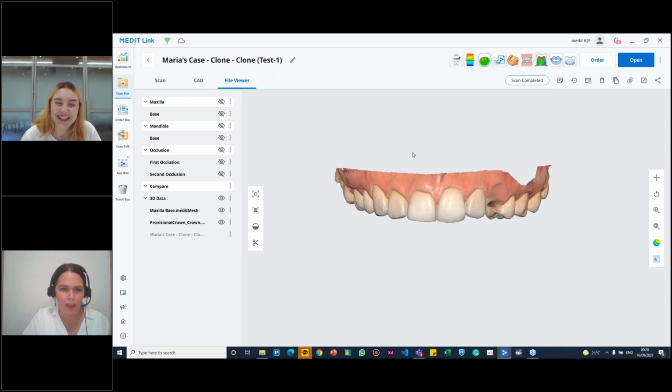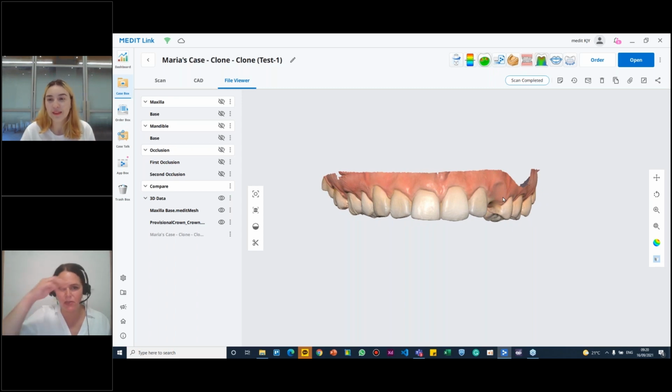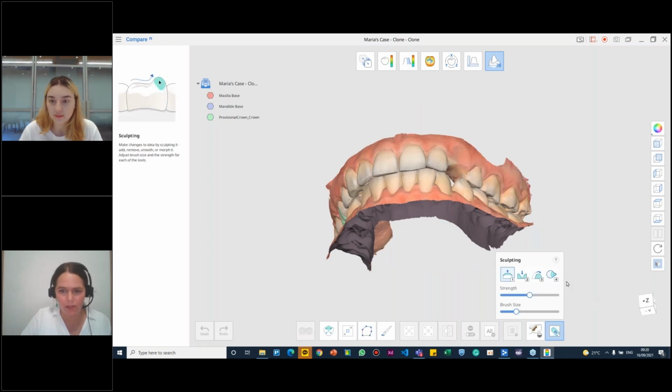Awesome. And then we did have one question that just came through right now. Maybe we need to backtrack just a little bit because I want to get this question answered if we can. What buttons are you clicking to morph the image, or I guess to make adjustments or changes? Can we just open that one more time? I just barely caught that this image was there, and we're grateful that you guys are, we'd love to hear from you. So there at the bottom right-hand corner. Yeah, so morph is number 4 on the keyboard, number 3, number 2, number 1. So I'm just pressing keys. Okay, perfect, thank you.